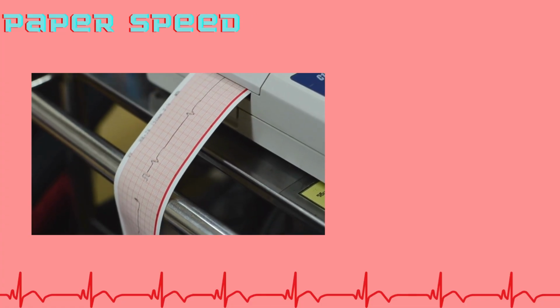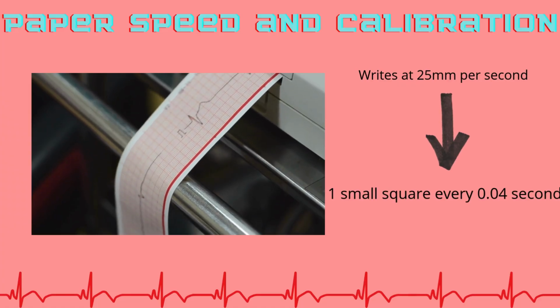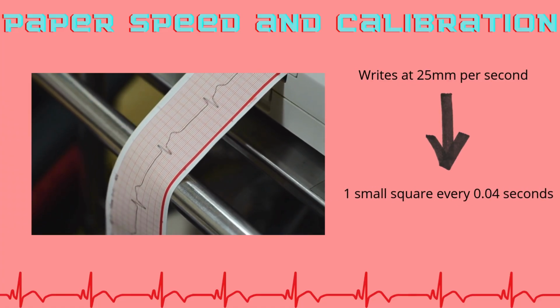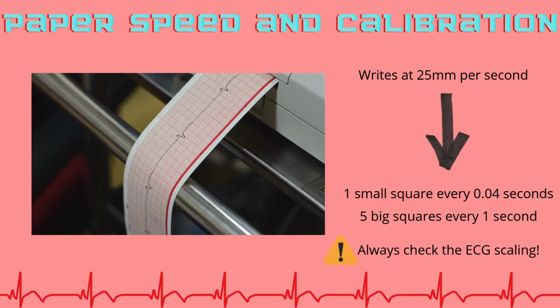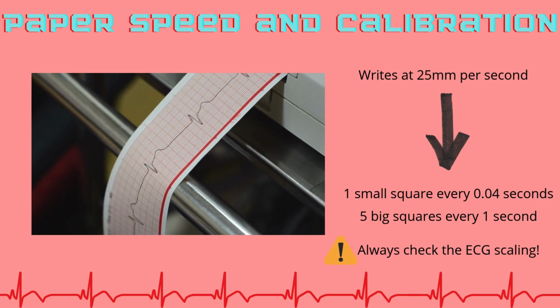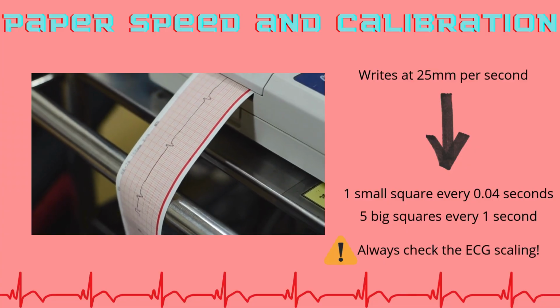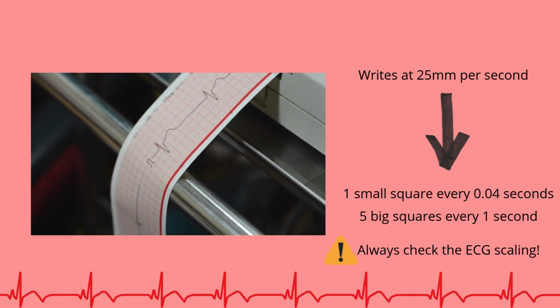The standard ECG paper speed is 25 mm per second. At this speed, you get 1 small square every 0.04 seconds and 5 large squares per second. Always verify the calibration box at the beginning of the ECG trace. A normal calibration signal is 10 mm high and represents 1 millivolt. This confirms that the ECG machine is correctly scaled.